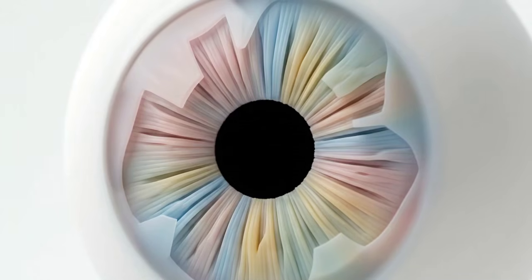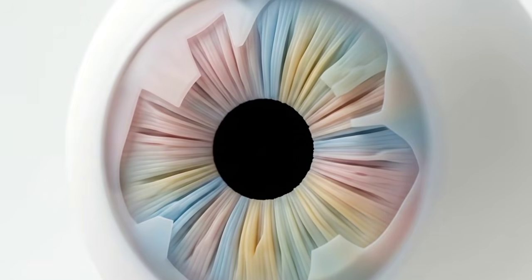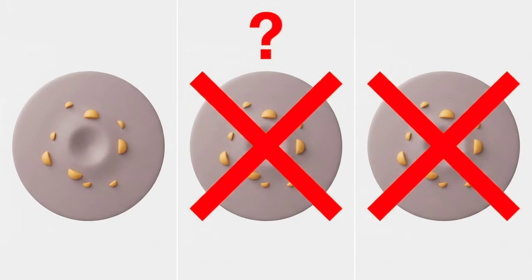In the high-stakes world of retinal diagnostics, a single clinical misinterpretation of symptoms can lead directly to irreversible vision loss. Yellowish macular deposits and pigmentary changes trigger an immediate reflex, early AMD. But that's a trap. 2 of these patients actually have high-risk phenotypic mimics.